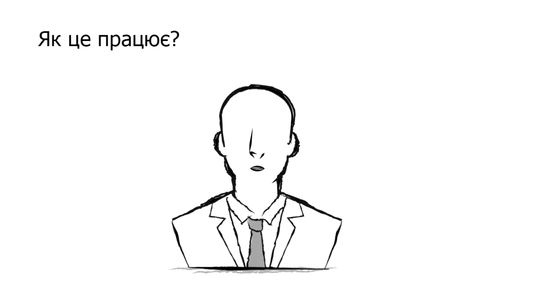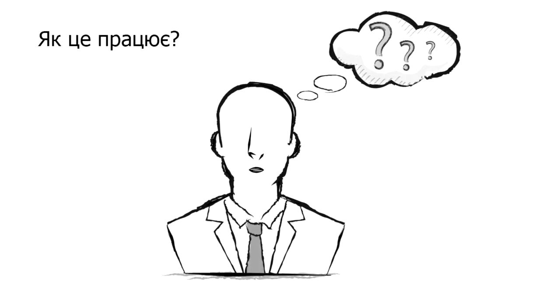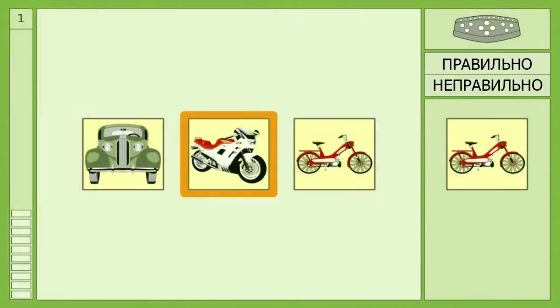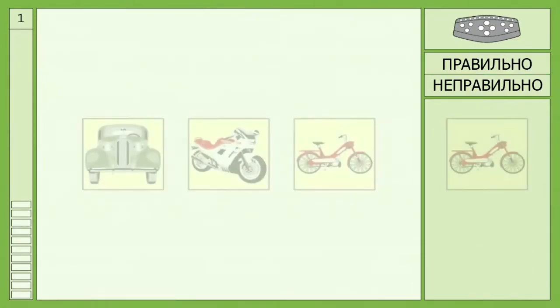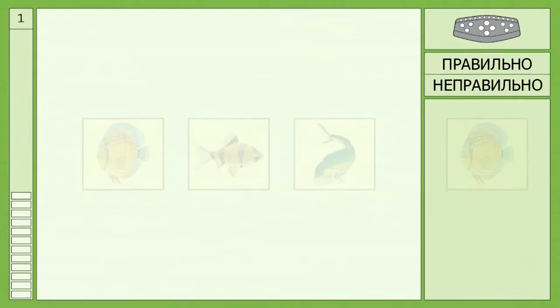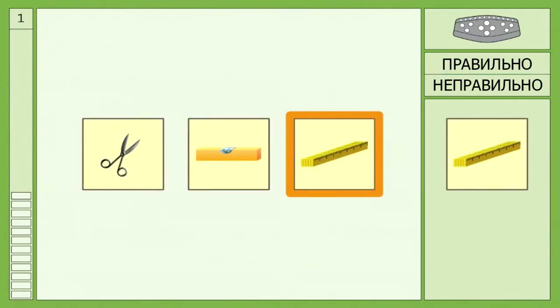We will explain, as an example, how one therapy module works. This knowledge can be translated to all other modules because they follow the same principles and structure. Each therapy module starts very, very easy. In this example, the first level of difficulty of the therapy module, attention and concentration, is shown.